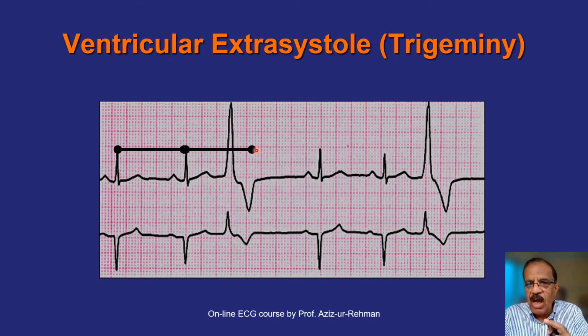Why did it not come? Because of this ventricular depolarization, which depolarized the ventricles but did not enter the atria. Atrial depolarization here could not produce a QRS complex because the ventricles were refractory. So a sinus depolarization of the ventricle was dropped here, because for the atria it is as if nothing happened. The next atrial beat would be expected at its normal time, so the next QRS will come at its normal time.